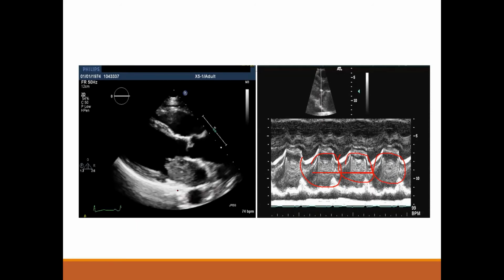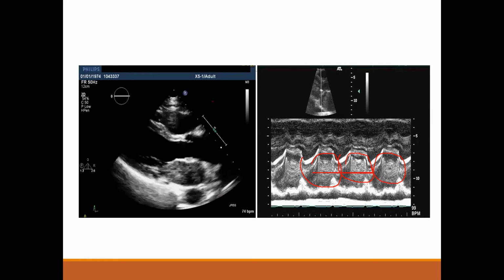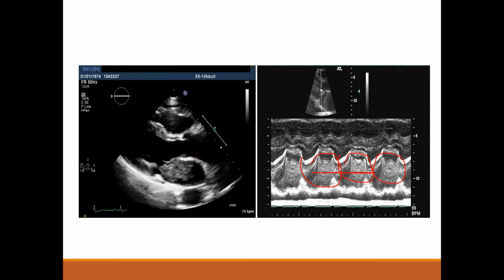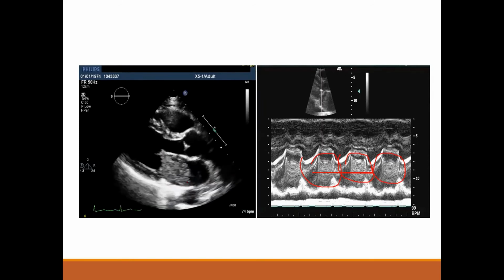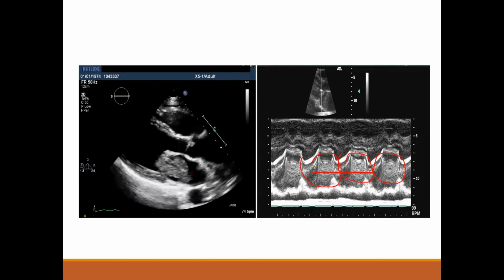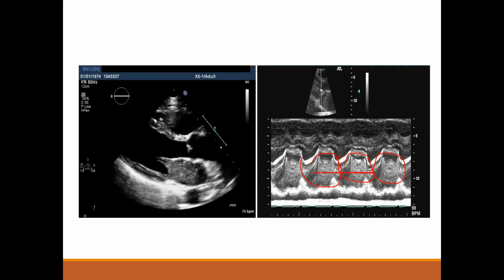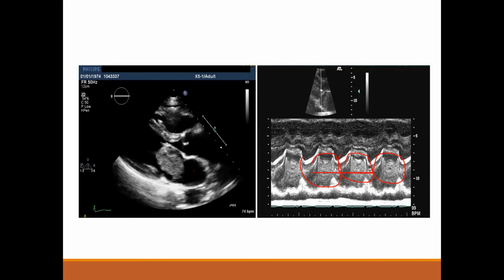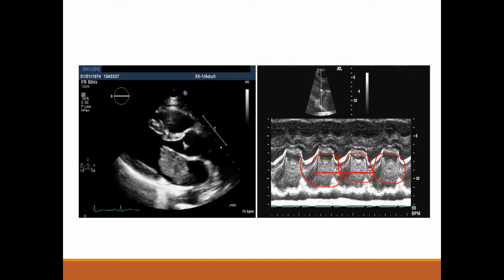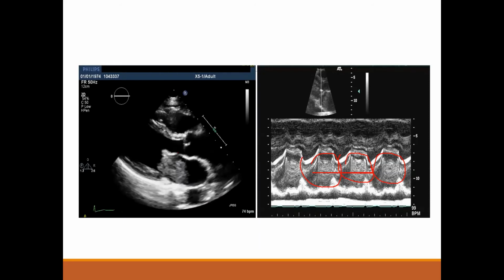Most probably myxoma. Don't shy away from saying it's most probably myxoma, but don't say this is myxoma. But don't leave it blank. Don't describe the mass and stop short of giving a diagnosis. But don't give a categorical diagnosis, meaning a single one that you are sure of, because we are not sure. Most likely myxoma, it can be sarcoma, it can be some other diagnosis. But most likely it is myxoma.